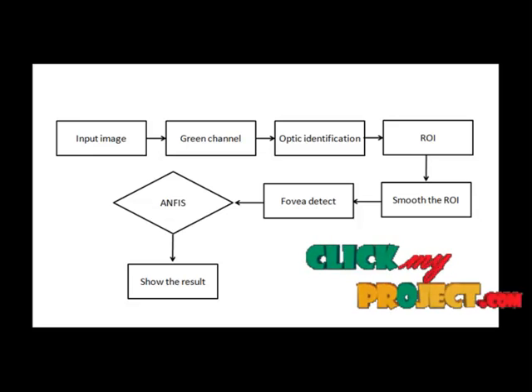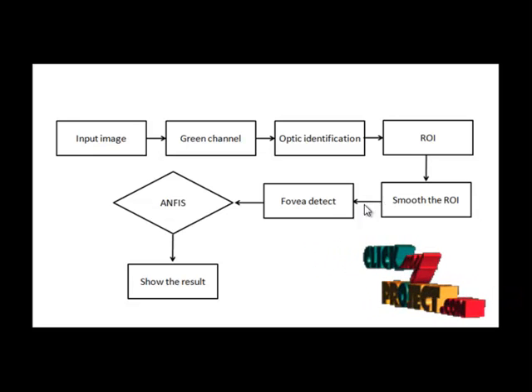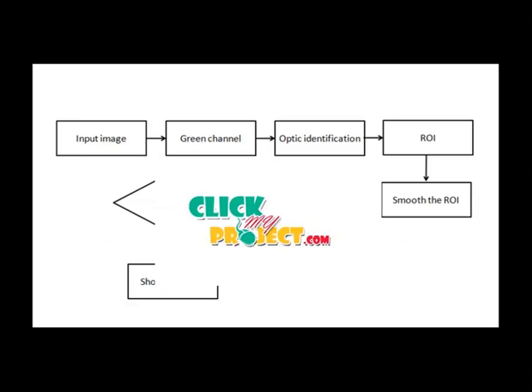In this image, first we select the region of the affected area. Then we go to the fovea detector. The fovea detector uses the fuzzy C-means clustering method. The algorithm is an iterative clustering method that produces an optimal C partition, minimizing the weighted within-group sum of squared error objective function. Finally, the resulting images are classified to the fovea center.